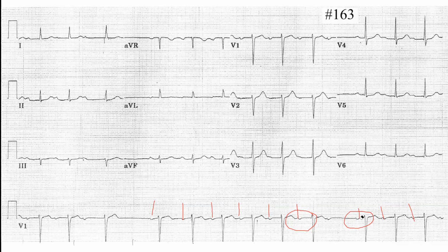Okay, so what does it mean? So it's Mobitz type... Mobitz type 2? Again, the theory, you should watch the theory and learn it. If the last one is the same as the first one, that's Mobitz type 2. If the last one is longer than the first one, Mobitz type 1. Okay, that's a Mobitz type 1.